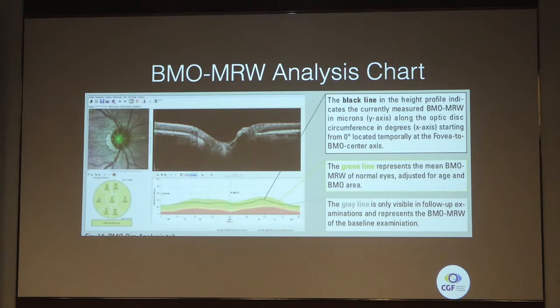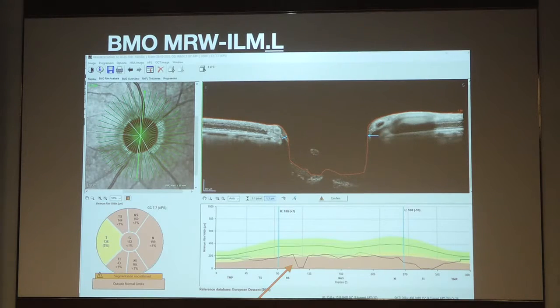It shows, if the diameter of the optic disc is smaller, how it will be shown, I'll just show that. And you can see there is another small gray line, that is the follow-up line. So there are 1 or 3 lines. Totally there will be 3 lines if a follow-up is done. So we'll describe that one by one later.